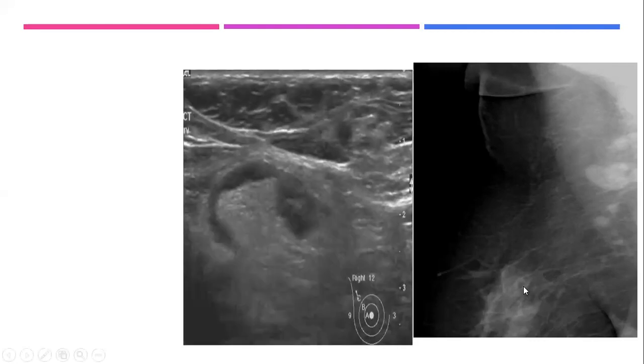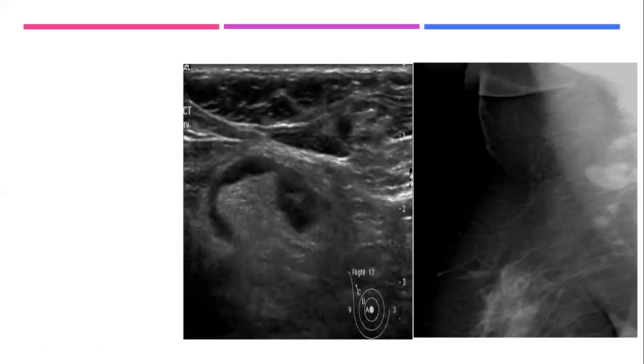But if you go for ultrasound, look at the ultrasound. Ultrasound shows the fatty hilum is there, but it is big and irregular, and it is bulky at one side of the lymph node. You have heterogeneous focal cortical asymmetry. Yes, and heterogeneous, not at the same density. Excellent. So yes, ultrasound definitely solves the problem.